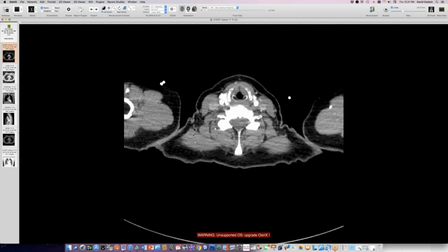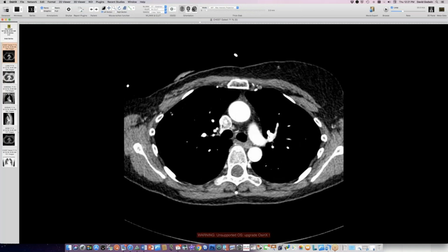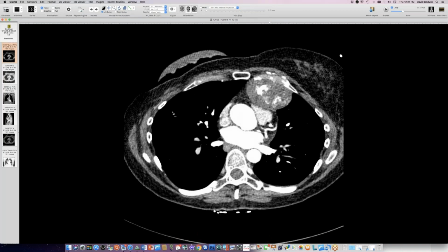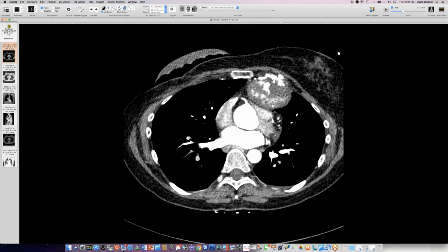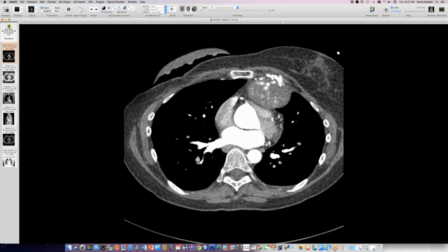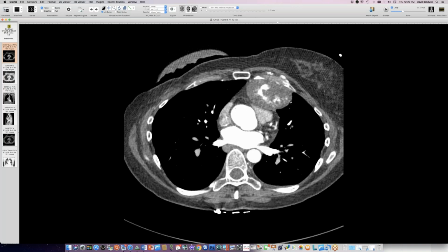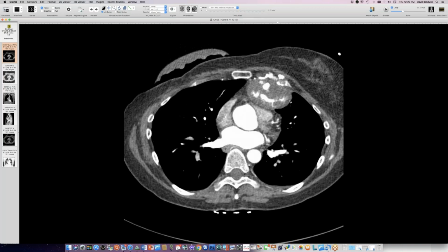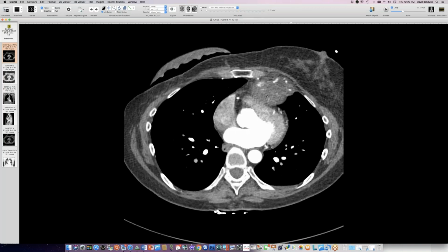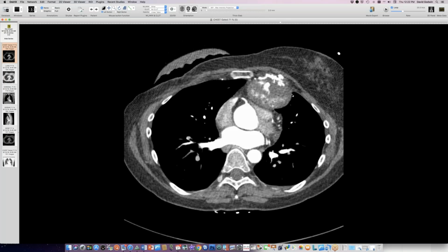Okay. Yeah. So here's a person with a subtle abnormality of the chest wall here. This lesion is associated with this anterior chest wall here, and it's pushing into the lung. And this has been slowly getting bigger for the last 8 years. So this lesion's been there for some time, and it really has a lot of big fat vessels in it. And this was finally resected en bloc with a piece of chest wall at the same time.